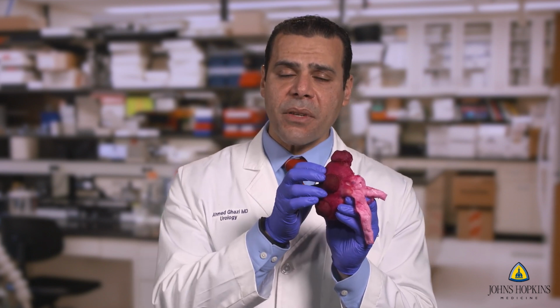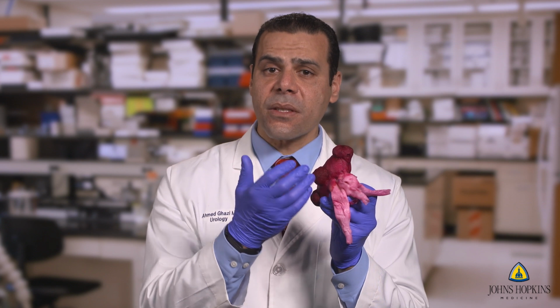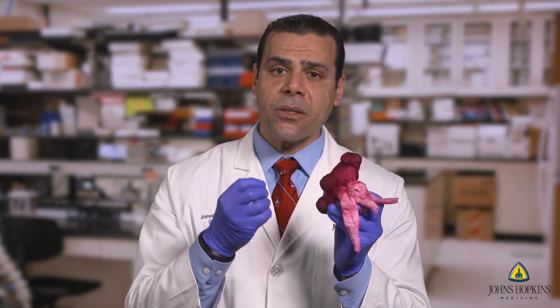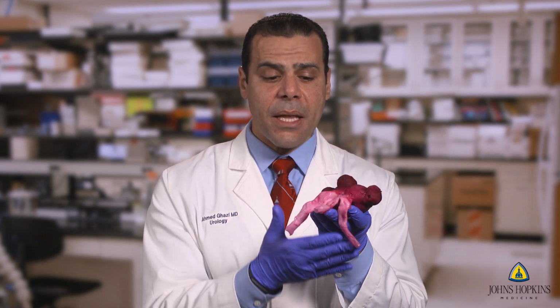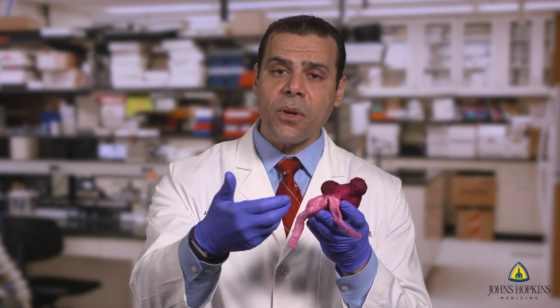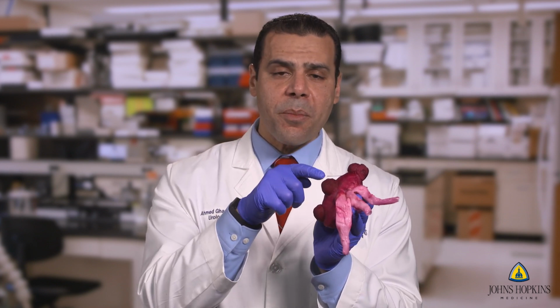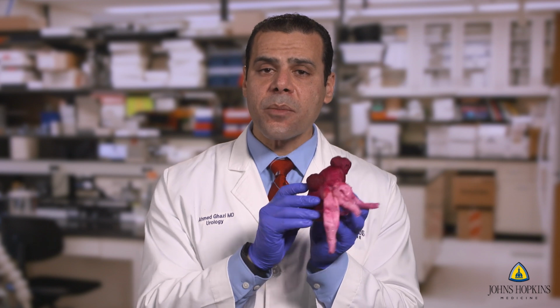This model has undergone a significant amount of mechanical testing to make sure that the texture of the tumor, the kidney parenchyma, the pelvicalyceal system, and the vessels actually replicate true live human tissue. We were also able to perfuse this model. This is through these vessels that we fabricated hollow so that you can flow fake blood all the way up to the base of these tumors, so that the person performing the simulation has a true realistic experience of bleeding that happens during partial nephrectomy. But also, when they actually suture the base, they're able to control that bleeding. So truly an immersive experience.